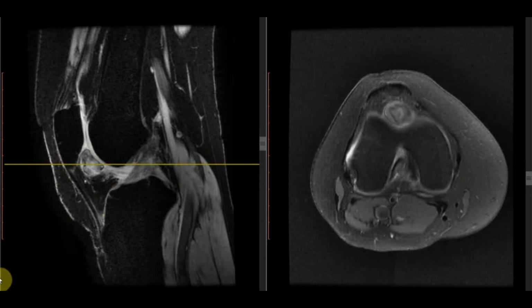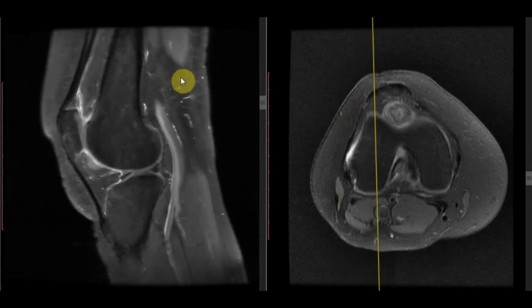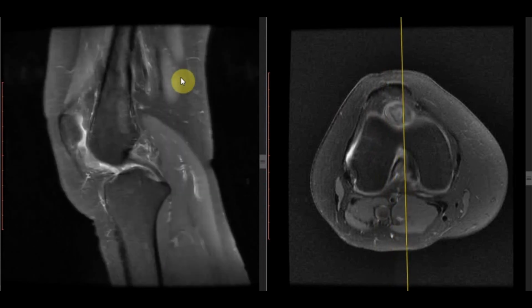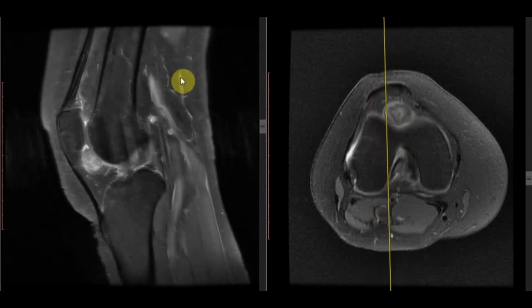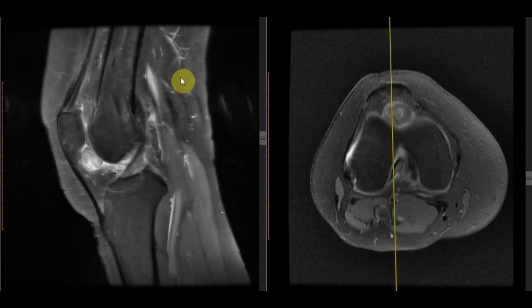We also have a contrast sequence. On the post-contrast T1-weighted sequence, we can see the lesion is showing diffuse heterogeneous enhancement. So the lesion is well defined, lobulated, appearing hyperintense on PD fat-sat, showing areas of hypointensity on T2-weighted sequence and on GRE. So this is a case of focal pigmented villonodular synovitis. This is a classic location for focal PVNS.